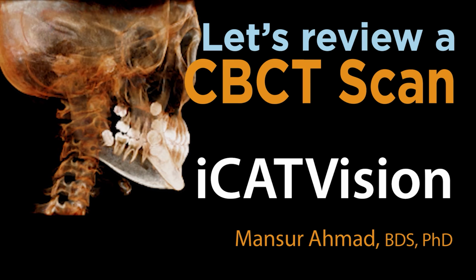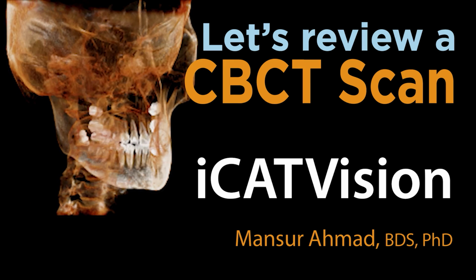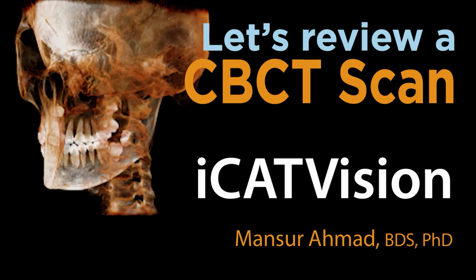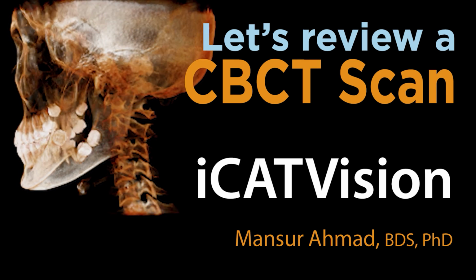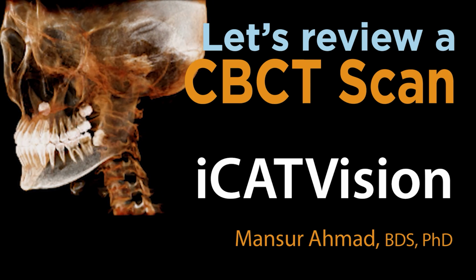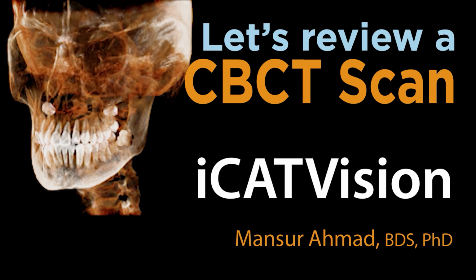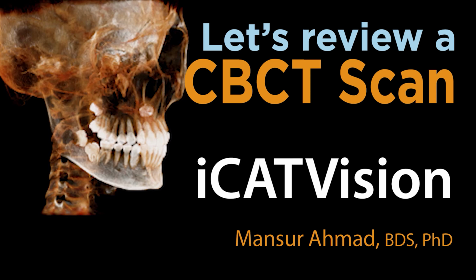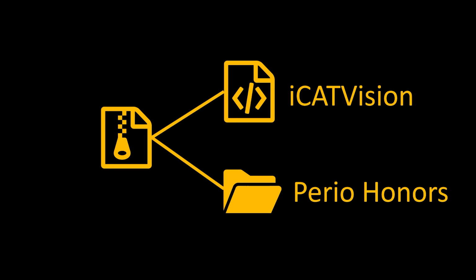Today we are going to use iCATVision to review a CBCT scan. We use this scan to teach a Periodontics Honors course. It does not matter whether you are taking the Periodontics Honors course or the Summer CBCT Interpretation course. This video is for you. In this video, I am going to teach you about the software and image manipulation.